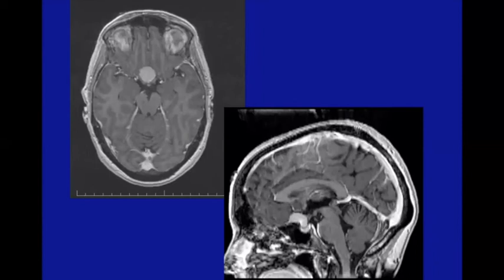In this case, this is a meningioma of the tuberculum sellae, which is drooping down into the sella. The surgical approach here would be wrong to come from a transsphenoidal approach because in a sense, the first thing you'll come to is the pituitary gland itself, not the tumor. So again, this is important to recognize, this is not a pituitary tumor.